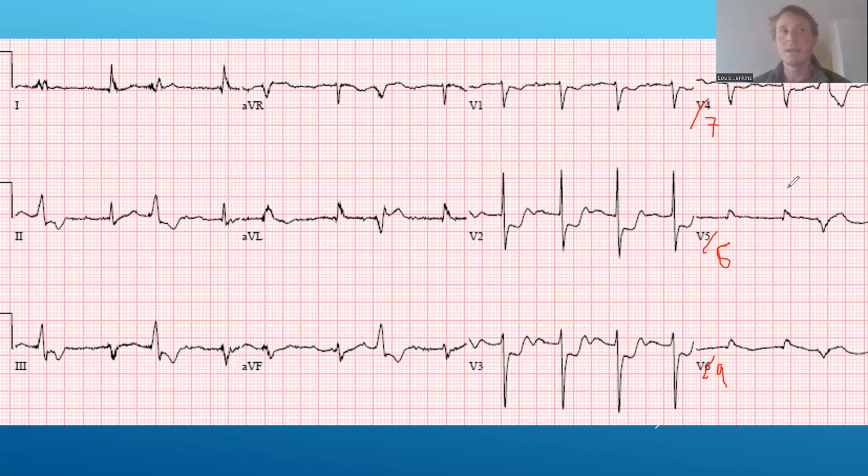And I think that's also why the heart attack admission guidelines say to just use a cutoff of 0.5 millimeters. It's because the ST elevation is likely to be really subtle if you do a posterior. So my advice would probably be, if I saw depression like this, just take the patient under high-risk ACS, query posterior MI. There's nothing wrong with that. They're going to end up at the same destination, speaking to the same cardiologist, as far as I'm aware. But if you do the posterior, you can say it's a confirmed posterior MI, and that might trigger a slightly different response. You can take them under STEMI.